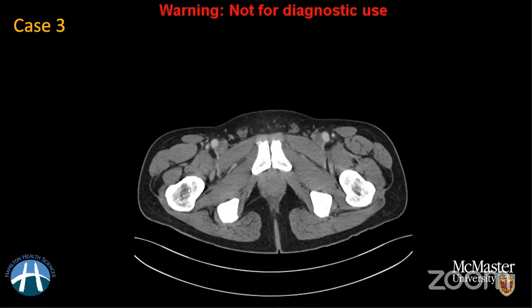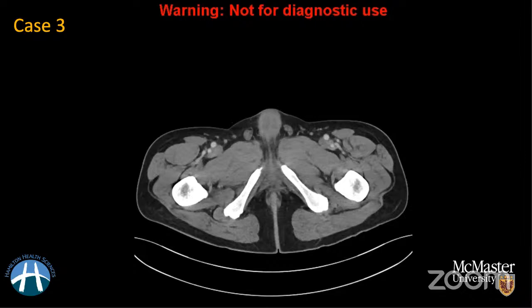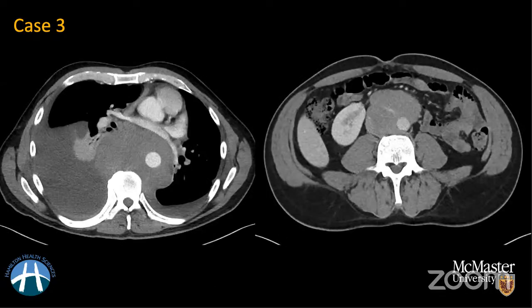So what do you think would be your differential? So let me get you the findings which are most significant here. So what do you think are your differentials in this case? Okay, that is really great, Ayush. Lymphoma versus testicular mass. Excellent thought.